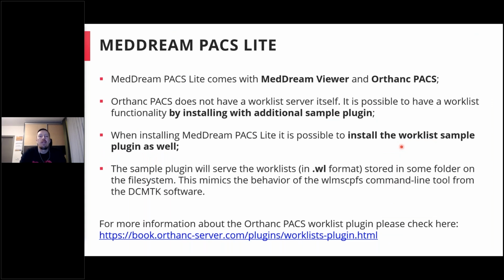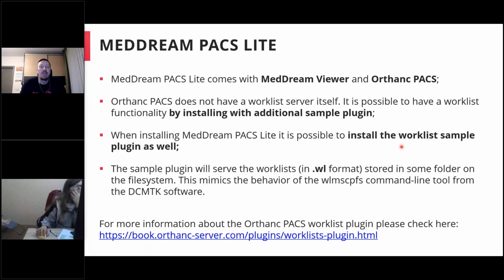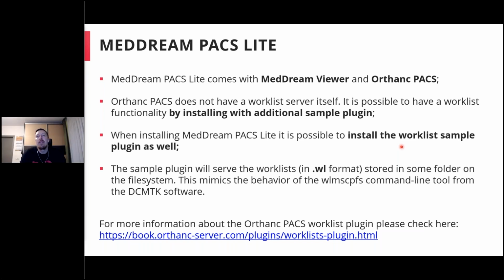So now let's talk about our other tool package, MedDream PACS Lite. Of course, it comes with the MedDream viewer and with Orthanc PACS. Orthanc PACS by default doesn't have any worklist server itself, but it is possible to have worklist functionality by installing an additional plugin.